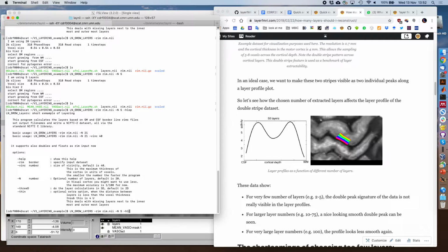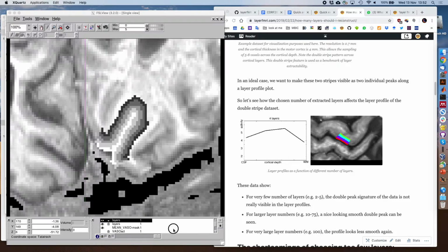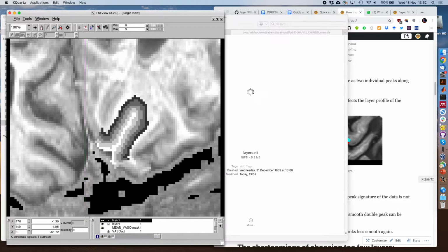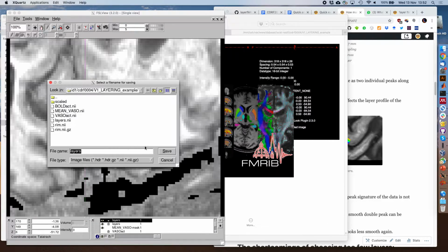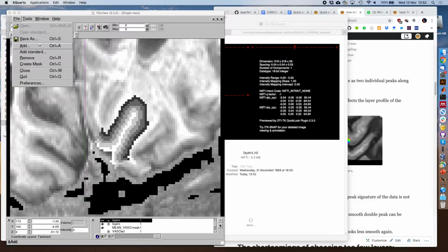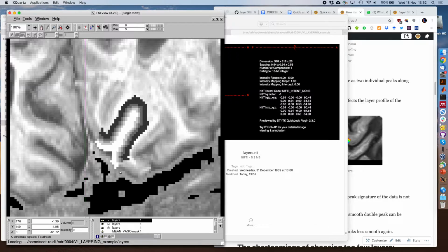So for example, if we do minus thin now and compare that, you will see that the layers are slightly shifted. Not in this one, sorry. I want to view it in this one on the server. Now we have new layers, which is kind of like amplifying the superficial and deeper ones.